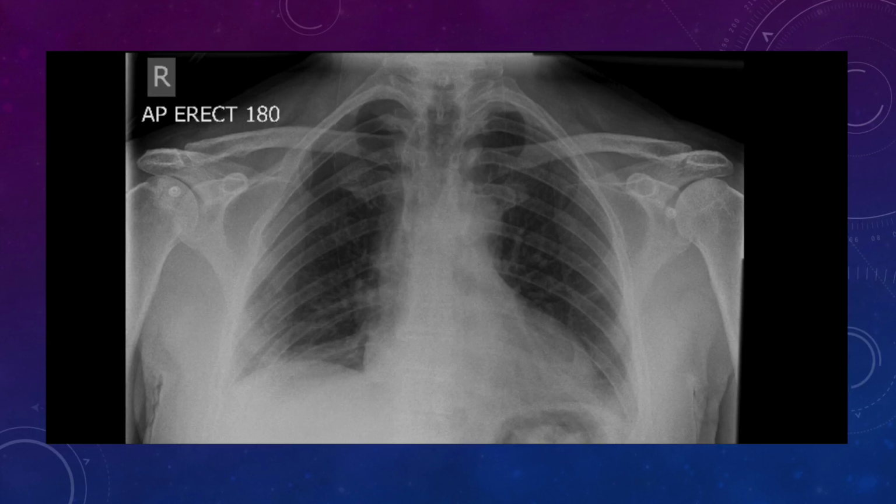How about this one? Trauma patient, road traffic accident. I can see I've got my work cut out this afternoon. Fractured right ribs. Quite a few of them, yep, fractured right ribs. So we have a rib fracture. Probably that one as well. This one is quite badly displaced, and this one, and probably that one. If we CT them, there's probably even more.